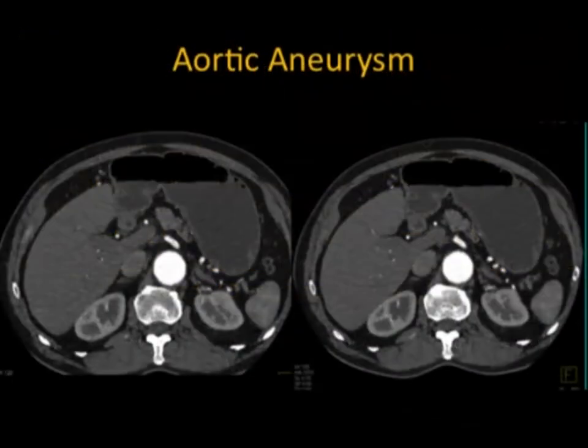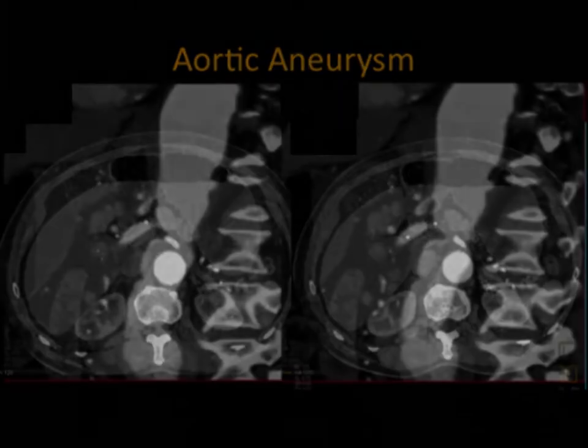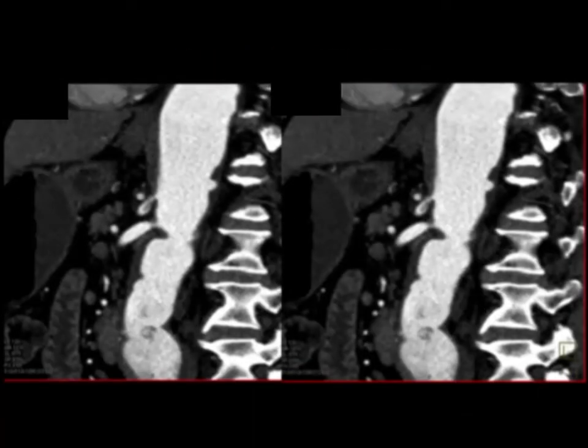For most patients, abdominal aortic aneurysms like this one are inconsequential. They usually do not keep growing. They typically are stable, and they will cause no problems. Obviously, in some percent of cases, these will continue to enlarge, and in theory, they can rupture and cause the patient's demise. So it's really a strategy of how we deal with these aneurysms. Obviously, the larger the aneurysm, the more the danger.